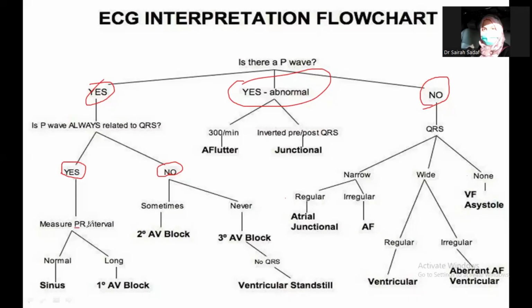Now look at the PR interval. Is PR interval normal? It's sinus rhythm. No worries. If PR interval is long, it is first degree AV block. Good? Easy?